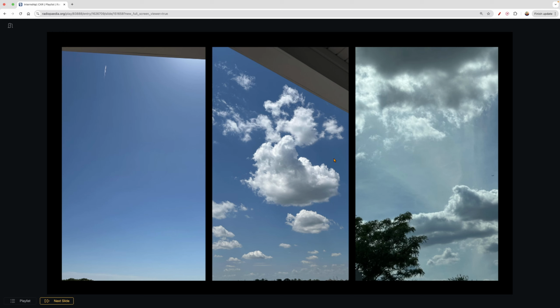Now we have these next images, and this one in particular. How would you describe this? Would you describe it as a white continuous consolidation? Because if you did, then congratulations, you're a radiologist. But truly, how would you describe it? Right, it's white, it's fluffy. You know it's not supposed to be there, and that's pretty much like radiology in a chest radiograph. You'll see something that's white and fluffy, and might be pneumonia, it might be pulmonary edema, and we'll talk about ways to distinguish those later.